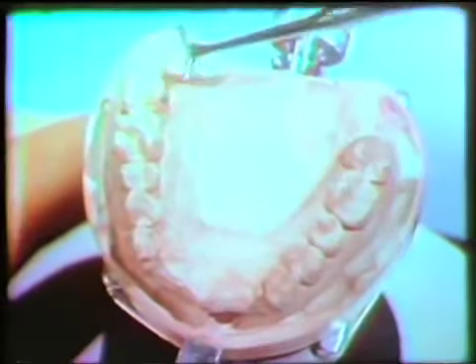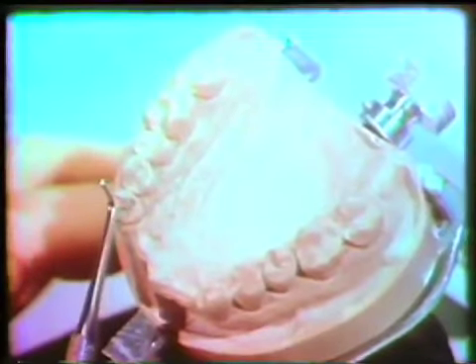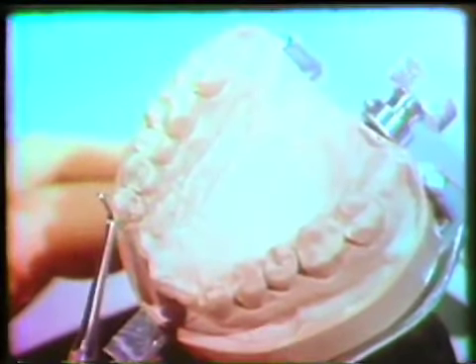After the appropriate mouth preparations have been accomplished, a master cast is recovered from a suitable impression. Conventional occlusal rests have been prepared on the maxillary second molars. Also, rests have been prepared on the maxillary cuspids, extending across the entire cingulum area. The cingulum rest preparations must be positive so that the appliance will not be able to move tissue-ward and the cuspid will not be able to escape the appliance.